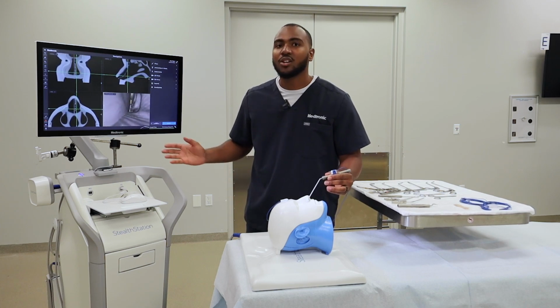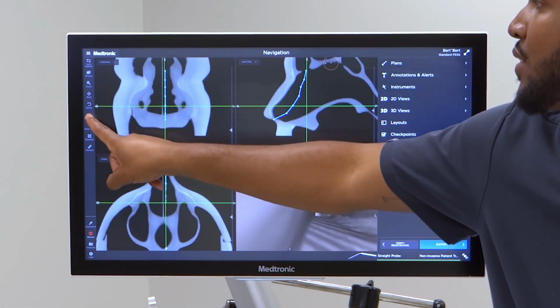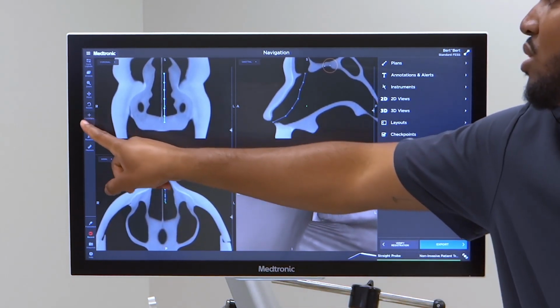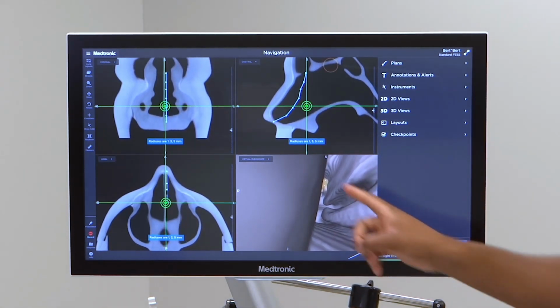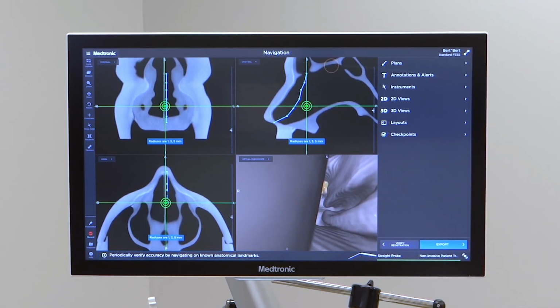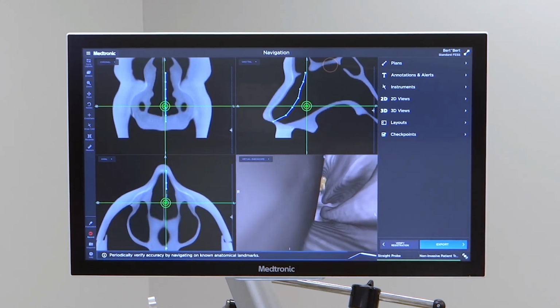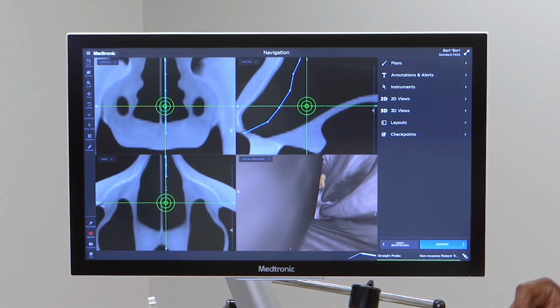One thing I'll point out also is you can play around with the different crosshairs, can toggle those. Now I'm just on the dot feature. If you click crosshairs one more time, you can now toggle to the target crosshairs. This message will pop up. Radiuses are 1, 3, and 5 millimeters. That lets you know, again, from the center, 1, the middle is 3, and the outer is 5 millimeters. So it helps you kind of gauge that unit of measurement.